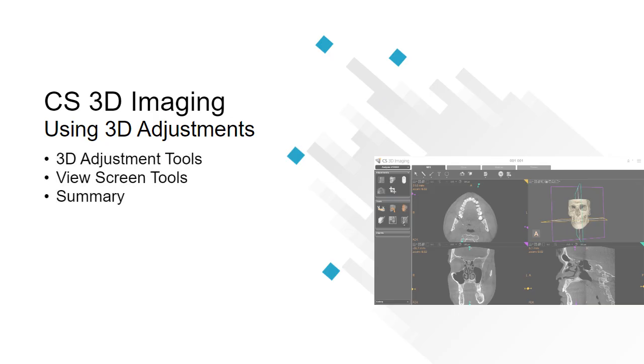Welcome to CS 3D Imaging using 3D Adjustments Recorded class. By the end of this class, you should be able to use the 3D adjustment tools and view screen tools in the MPR curve and bilateral tabs.